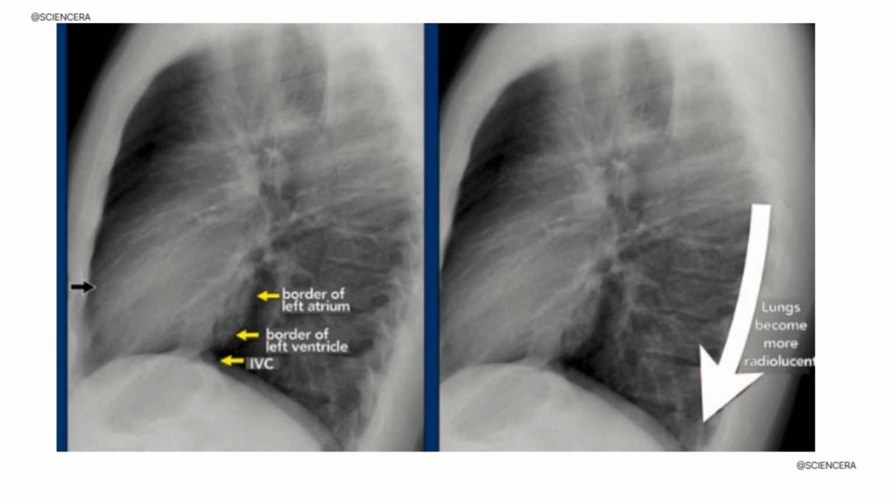As they look down the spine on the X-ray, the bones should get darker towards the bottom. That's because there's usually less tissue there, and if it gets brighter, it might mean there's a problem in the lower part of the lung, so they need to check carefully for any issues there. So here you can see that as it is going downwards, it's getting darker.